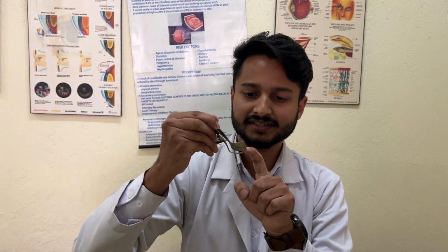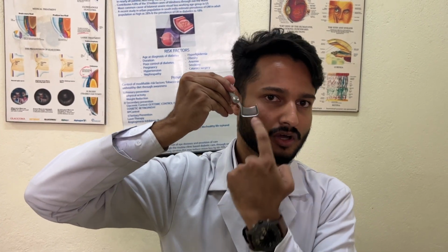You can see that this is a D-shaped plate and the U-shaped rim, and it should be used this way. As you can see, this will be exposed on my skin side, and another way we can use it is like this, where the D-shaped plate will be under the conjunctiva and this will be at the skin side. And if I use it alternatively, then it can harm the eye, so it is not used in both eyes. This instrument is for the right lower eyelid and the left upper eyelid.